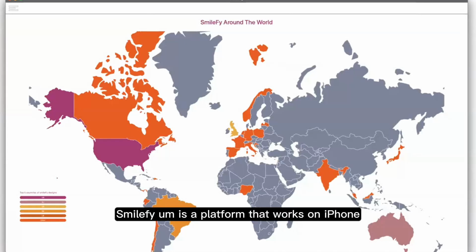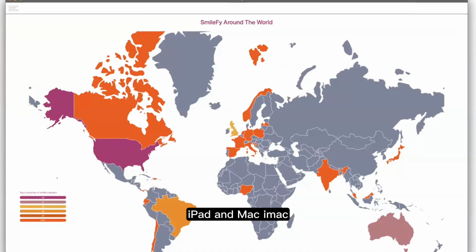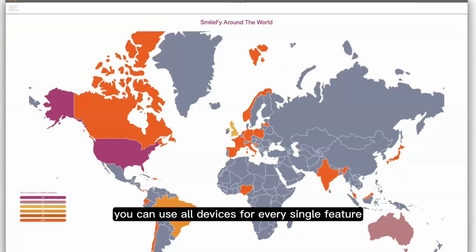SmileFy is a platform that works on iPhone, iPad, iMac, MacBook Air, and MacBook Pro devices. You can use all devices for every single feature.